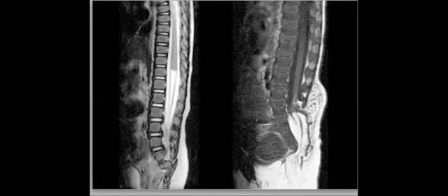So when you find the cord below L2, it is what is called tethered cord. So when you find tethered cord, what will you search for? You will search for fat. Yeah, perfect. When you find tethered cord, search for fat. When you find fat, search for tethered cord. So when you find one, search for the other. Then you can reach caudal regression syndrome.